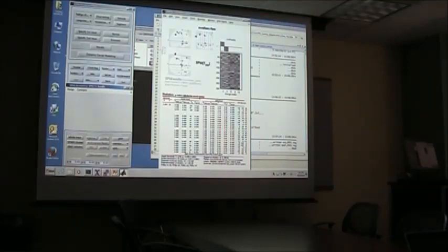So here's where you can make your choices, or at least get the output on your multiple comparison correction. You will often see that the family-wise error correction is more stringent, so it gives you a higher value than the false discovery rate, exactly for the reasons I showed in that illustration.